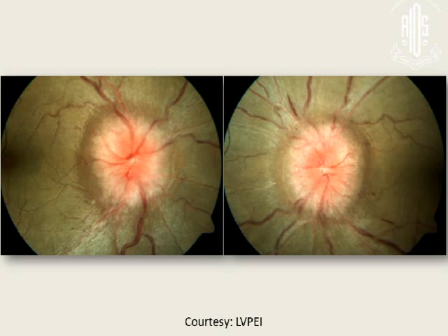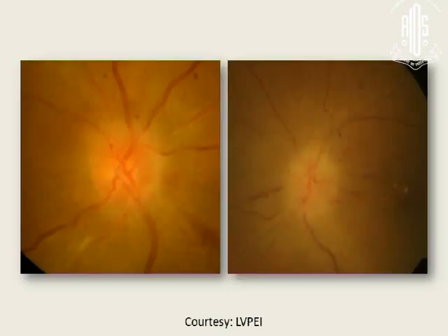There are hemorrhages. There are no hard exudates, but there are hemorrhages. Look at the veins. The veins are dilated. So these are all signs of true disc edema. And the neuroretinal rim is fortunately pink. That indicates that this is of relatively recent onset. In contrast, this patient has a long-standing papilledema, and we see that the neuroretinal rim here is pale.